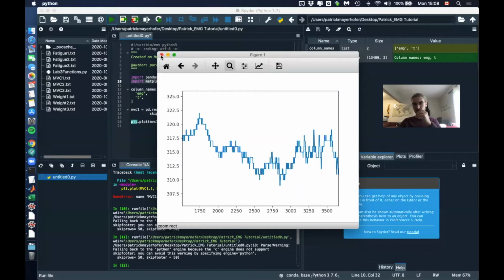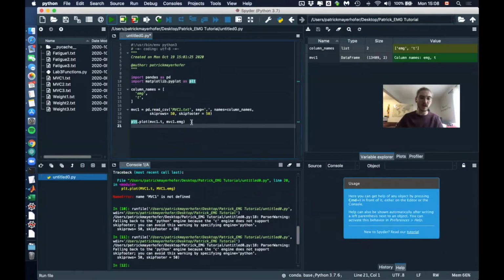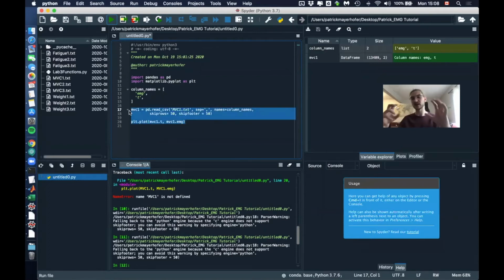But that's what we have to work with now. Anyway, so that's how our data looks. Let's now actually start with the actual data import, because I wrote a function for this that I would like to show you guys. But here, that's how you could just import it and have a look at each individual file.